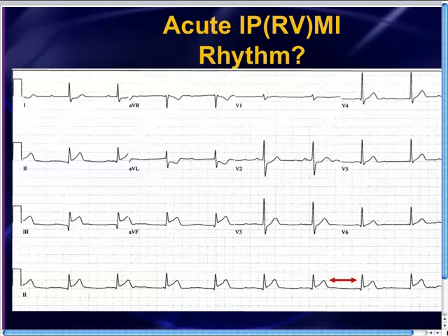So let me circle all of your PR segments in here. Well, I think there's a PR segment that's pretty darn long. And then that's a pretty normal looking one. There's practically no PR there. And then a really long one. And then kind of a longish one, and then it looks like it's getting a little bit shorter, and then a really short one there, and then a really long one there.